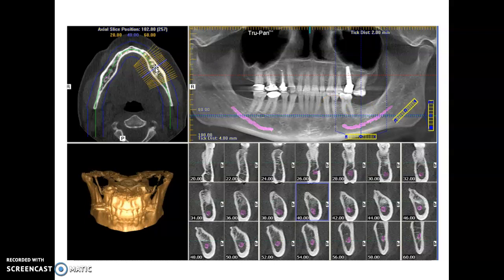But there's different ways to look at that. So if you took every one of these little slices, so every one of these yellow lines, and created an image going back vertically again instead of the horizontal view that you have here, if you took each one of these slices and looked at it again vertically, this is the slice that you're looking at. This blue line that's in the center of that little measurement here, this little ruler, this is the slice.